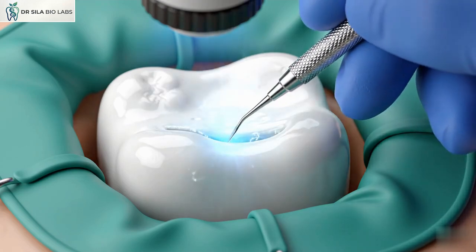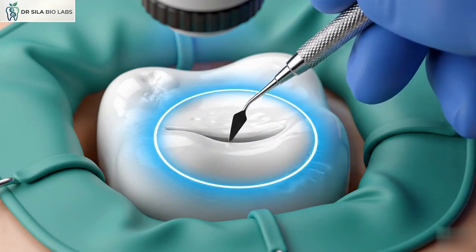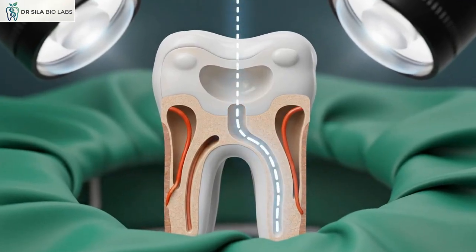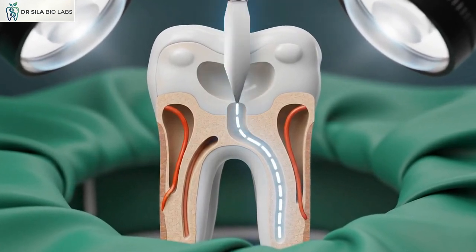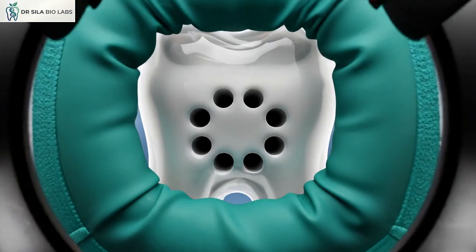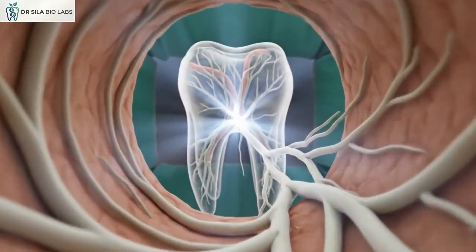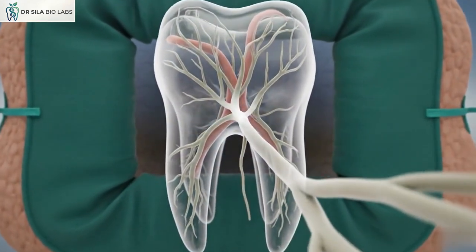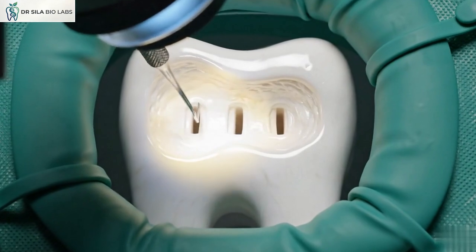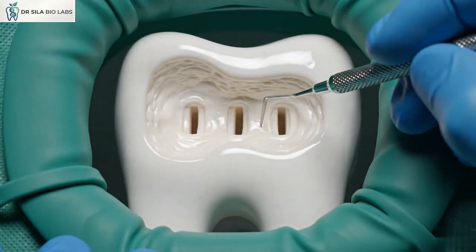To ensure a precise pathway, the Endodontic Explorer gently glides across the chamber floor. The glowing blue overlay. A properly designed access cavity is essential because it allows instruments to reach the full length of the canals safely and efficiently. Access opening, the gateway to root canal treatment. With the canals located and accessible, the cleaning and disinfection phase of root canal treatment can begin.